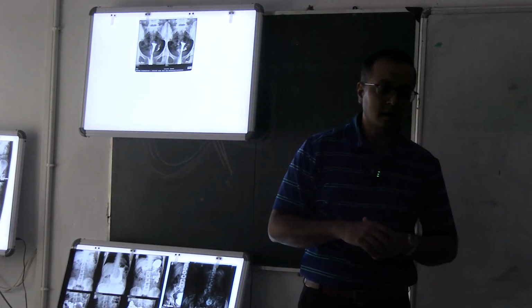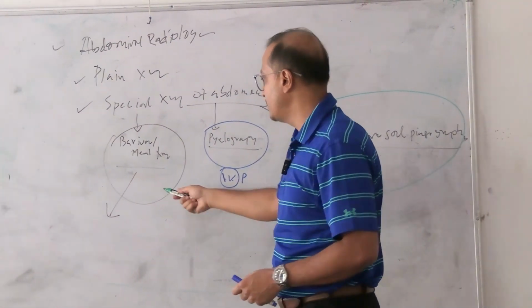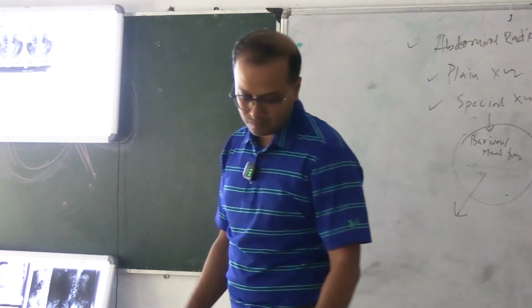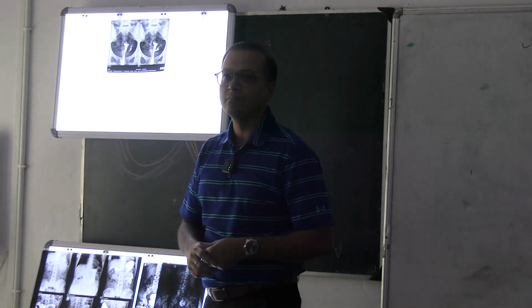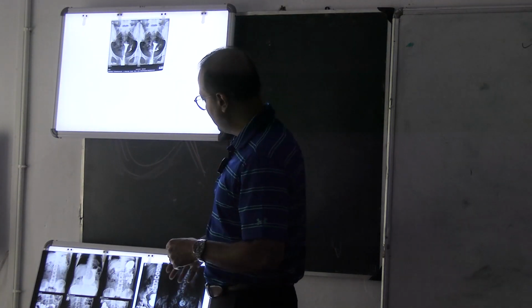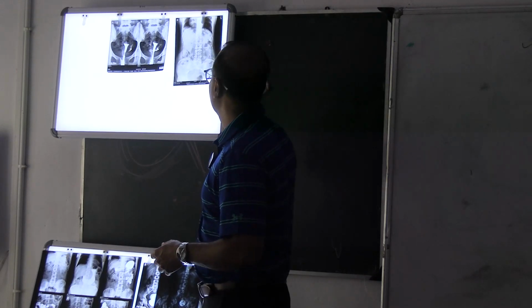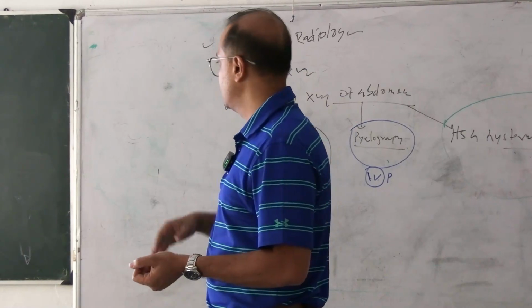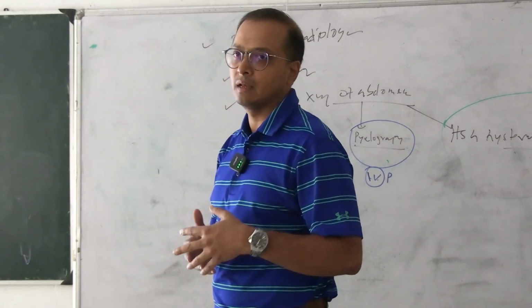This is how these special slides are read whenever you are going to identify them. There are three types of special slides present to us: Barium Meal, Pyelogram and Hysterosalpingography. There are several other types of special slides as well, but we have limited resources, so we are showing these. Other than these, there are many more. We will be studying them in books as well. But practically, we have only these slides to identify whenever you are seeing normal X-rays. So this is all about the radiology of the abdomen, or abdominopelvic radiology: general X-ray and special X-ray. Special X-rays are of three types, general X-ray only one type. Why special? Why general? We just have to give logic to it.